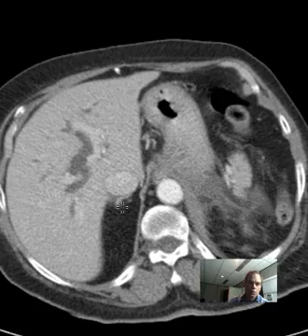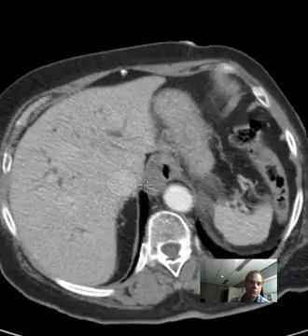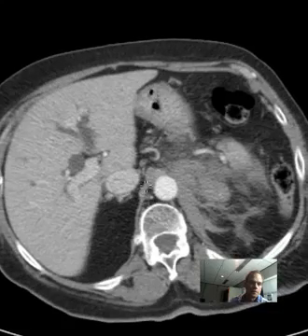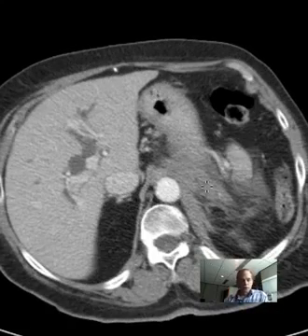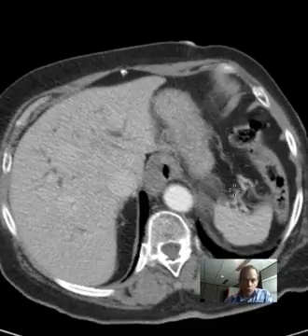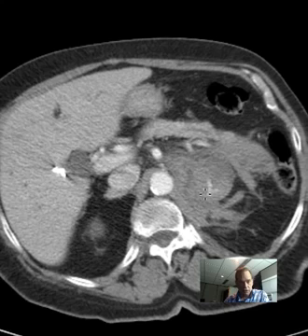So there's a nice normal looking adrenal gland with two very thin limbs, and that's right about where this is. So this is an adrenal hemorrhage, and furthermore you can see that there is active bleeding. So this is not a blood vessel in the middle of this hematoma, it is active bleeding. How do I know it's active?